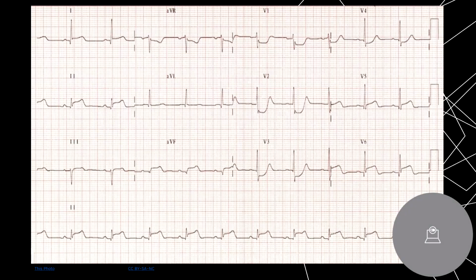All right, let's go to V1 and V2. We'll go to septum again. Okay. Oh man, you get significant changes here. So let's look at one complex. Right? Let's look at this complex. And then we'll go, look, this is baseline. Right? QRS.